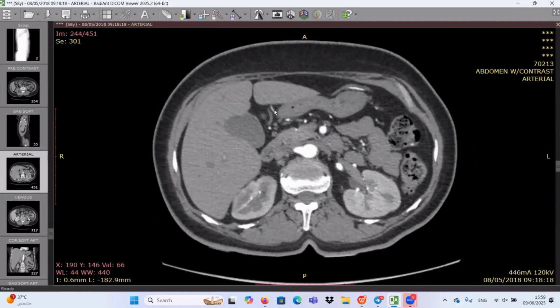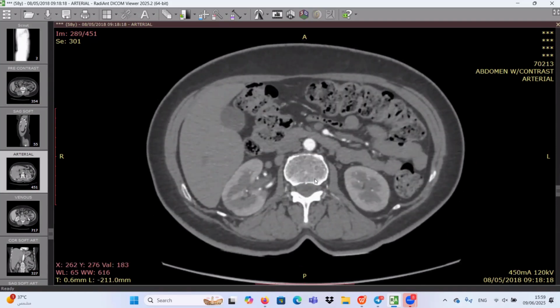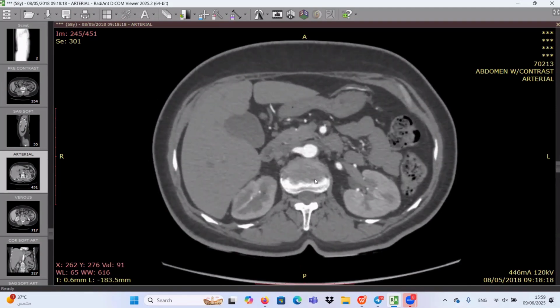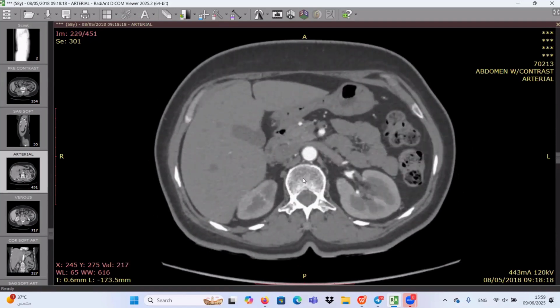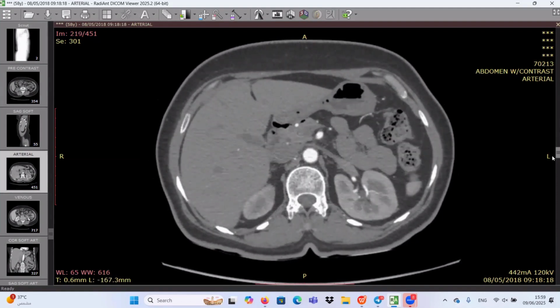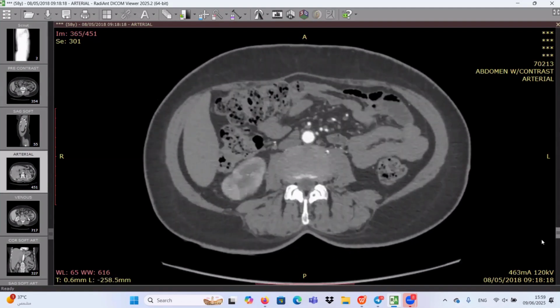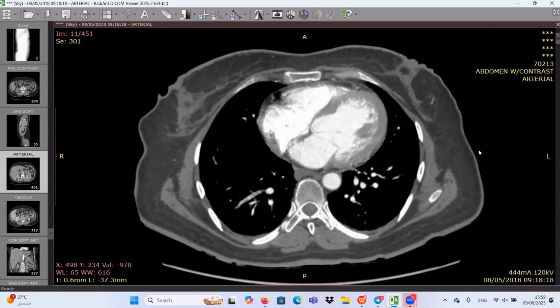Do you think the renal artery is obstructed? The distal, it's not actually, it's not obstructed. Not stenotic. Renal artery, one of the sites that you should check. Okay, what else? Yes, there was a periarterial soft tissue thickening, so I thought it must be renal artery stenosis or occlusion.